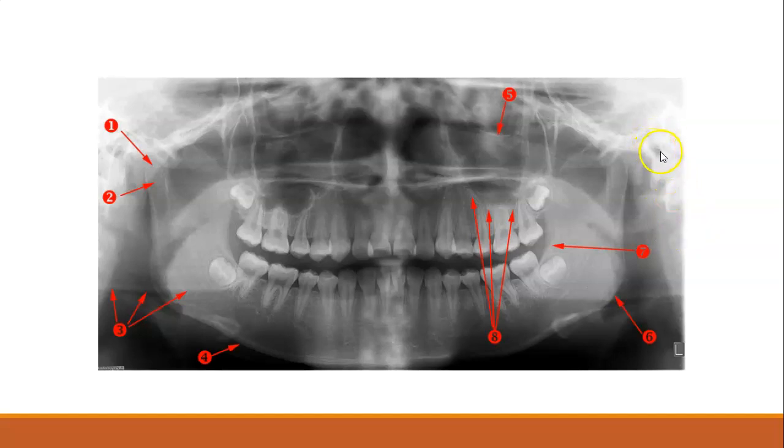there's the ear canal. See that really good little hole right there? And then is this the styloid process or is this? I think it's this because it's a little skinnier and longer. And then you can kind of see this tissue of the earlobe here. It's kind of soft tissue looking. So there's lots of things to pick out. When you're looking at some of these clear images, take a minute to look at things like air spaces.